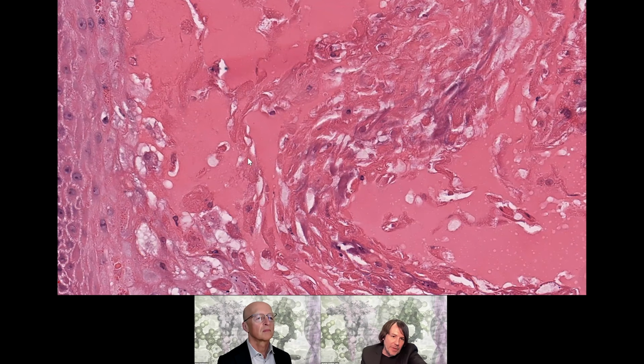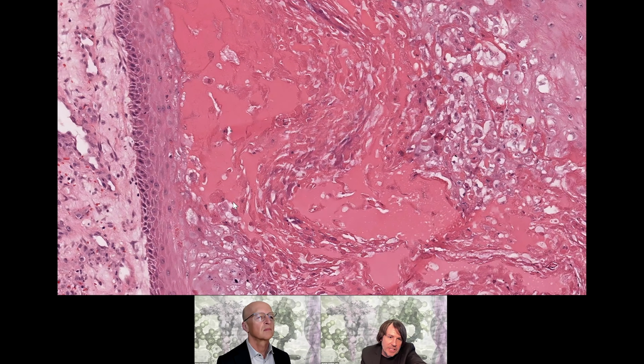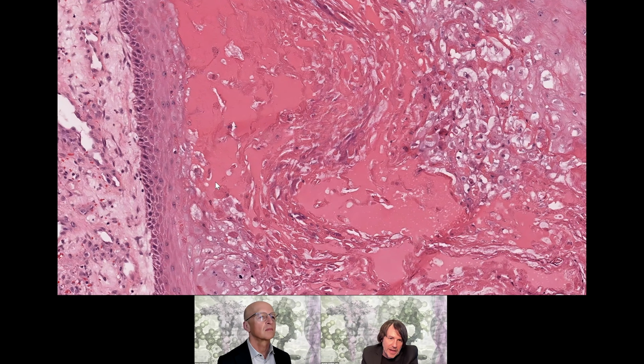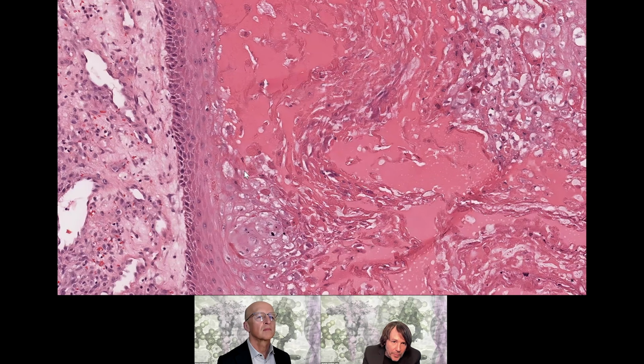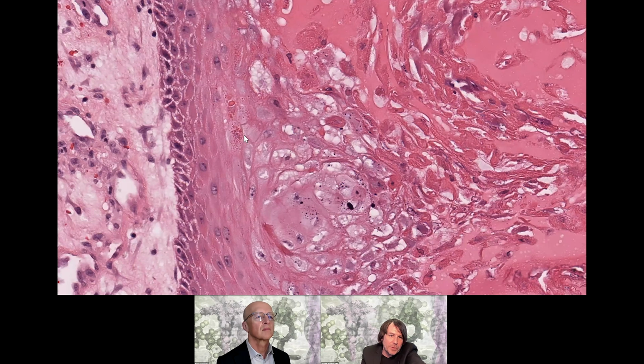So right at the bottom left corner of your slide, there's a little pink dot in a keratinocyte in the actual spinous layer down below the serum. If you zoom in a little bit, right in there, there's a couple dots. So there you go, that little pink dot just below your arrow. Is that an ORF inclusion? I don't know. I'm not 100% convinced because there's some tiny, tiny dots next to it.